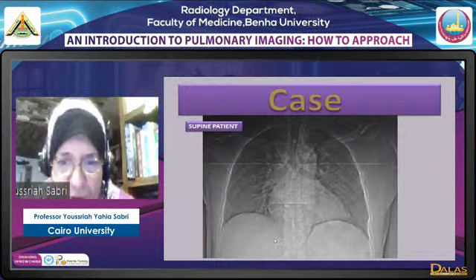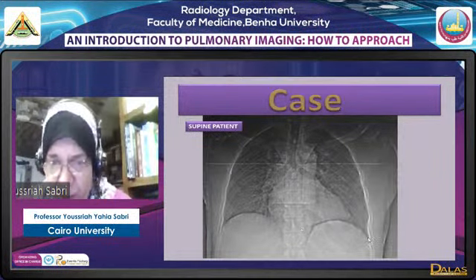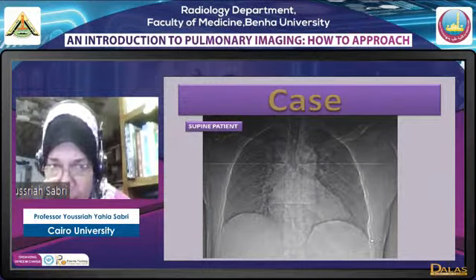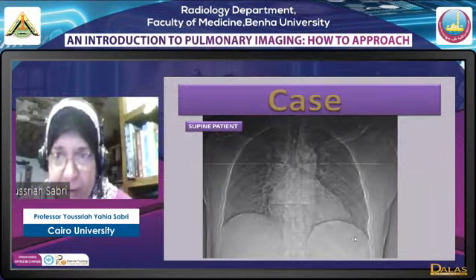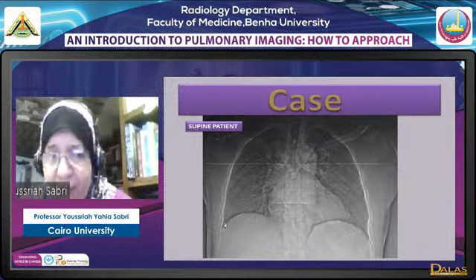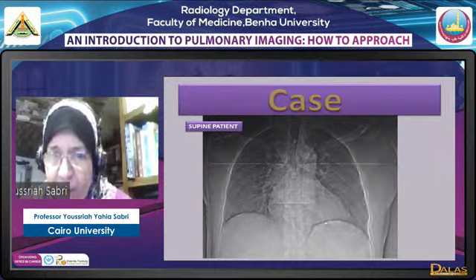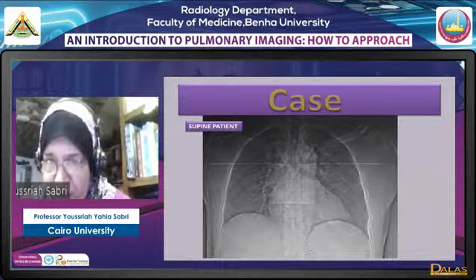Another supine patient, and here the lesion is, this is the normal. This is the deep sulcus sign, and it's even on both medial and lateral sides. And this is the clear diaphragm sign. But mark it, take care here, because you will have the same impression on the other side. You may have an impression that you have a clear diaphragm sign, so don't depend much on this sign. The most important sign to diagnose pneumothorax in a supine patient is the deep sulcus sign. Okay?